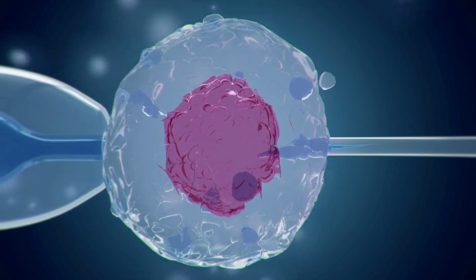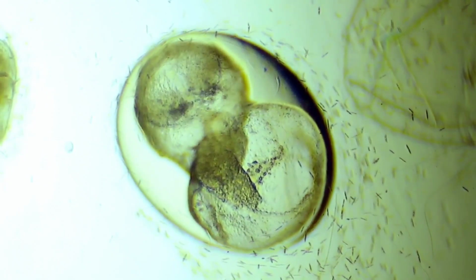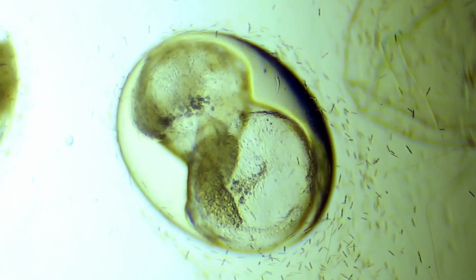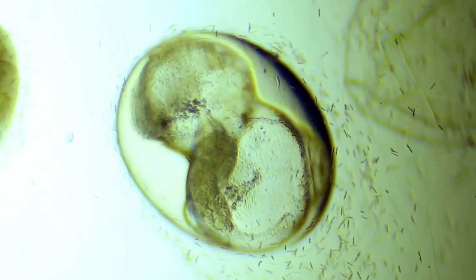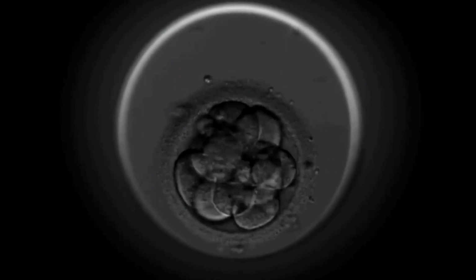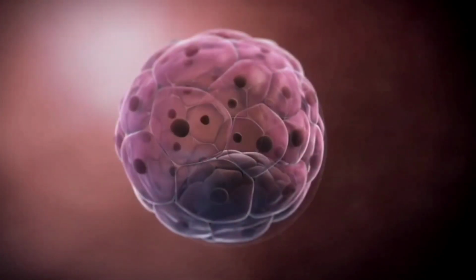Fourth stage: embryonic development. The day after the puncture, the fertilized oocytes, or zygotes, are identifiable by the presence of two nuclei, called pronuclei. One comes from the oocyte and the other from the sperm. Not all eggs are necessarily fertilized. Zygotes become 2 to 4 cell embryos within 24 hours, then 6 to 8 cells 24 hours later. In the majority of cases, the embryos are transferred 2 to 3 days after the puncture.